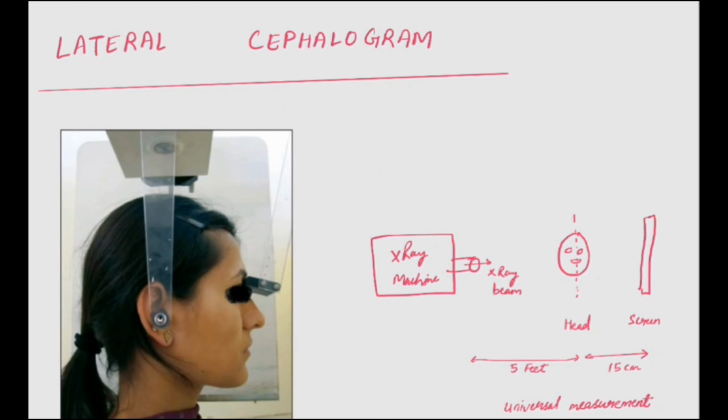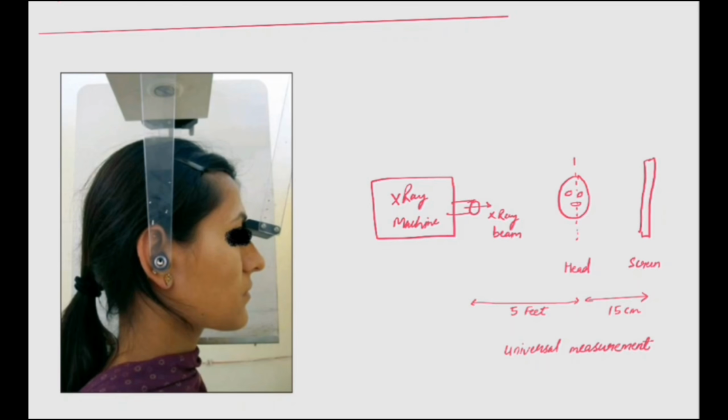In today's video, we will be discussing the lateral cephalogram. The lateral cephalogram is used in plastic surgery for orthognathic surgery. First of all, we will discuss how we take the X-ray properly.